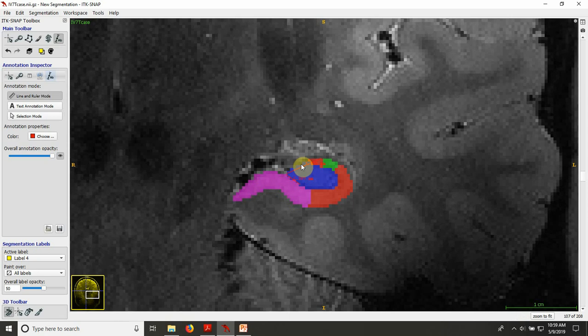But again, it's important to start at this edge of the hippocampus, of the dentate gyrus, and then it ends at this point of the dentate gyrus. And then the fourth line starts at this middle point, and then, oh, that's actually not at the midpoint. It starts at the midpoint and then is at a 90-degree angle, more or less. So everything in this region I'm gonna label CA3.